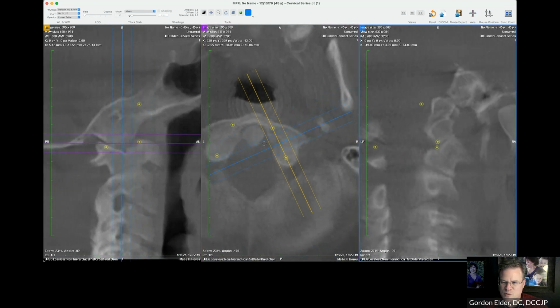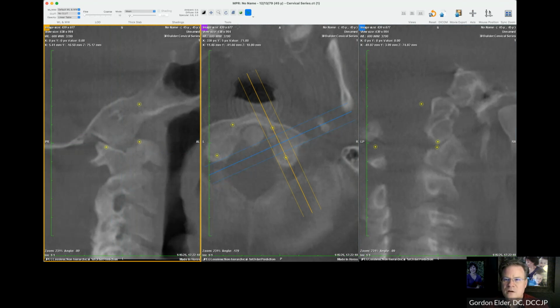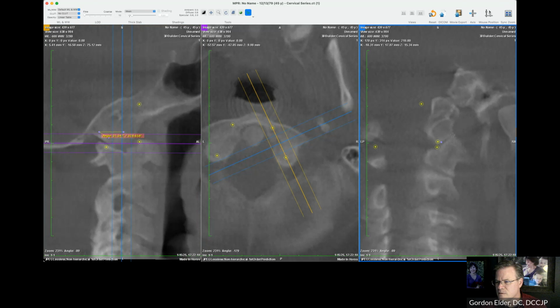So what we're going to do is come back, scoot back until we're at the thickest part of the joint, at the lateral margin there. I can see the convexity on the right and the slope on the right joint. Left frame, this is the right joint. Good. Let's measure that. Posterior 1/3 of the convexity. 31 degrees. Let's move over here. And 34 degrees. Okay, I've got all my angles.